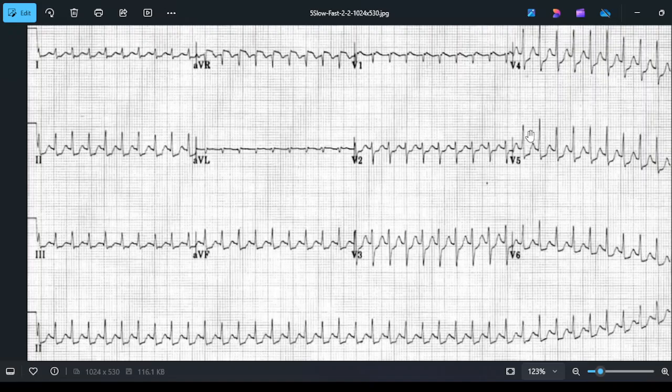Okay, first, initially, whenever you're given an ECG and you feel that there are too many crowded QRS complexes, just go to the lead strip, the rhythm strip. Okay, and again, from one square to another, it is 1.5 here, 1/4 block, then 1/4, then 1/4, then 1/4, right? One big block and 1/4 of the big block. That is the difference between RR intervals.